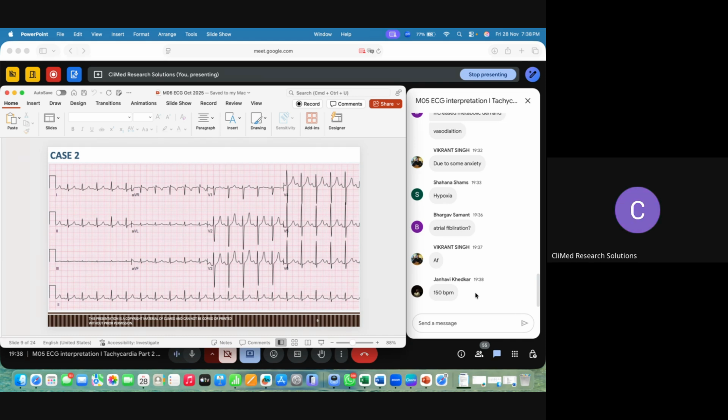What is the ventricular rate? It's very fast. Check. Very fast means how much? Calculate. Narrow QRS tachycardia, 150 to 180. Calculate. This is simple. You know how to calculate HR, right? Calculate. Guys, how much is it? 150 to 160. Okay.